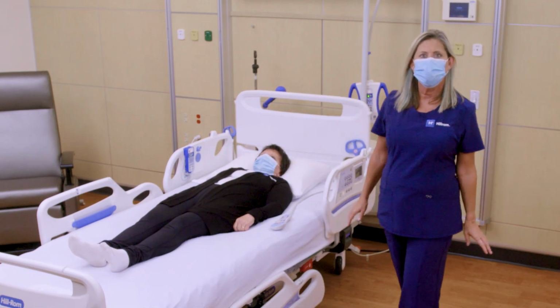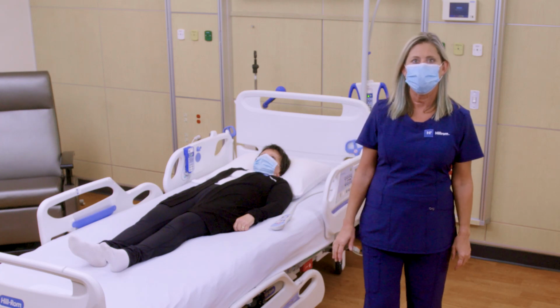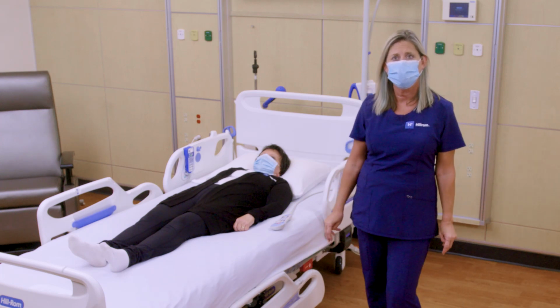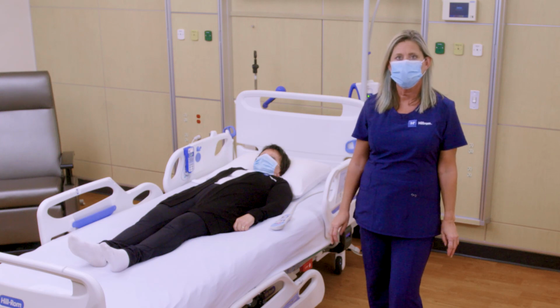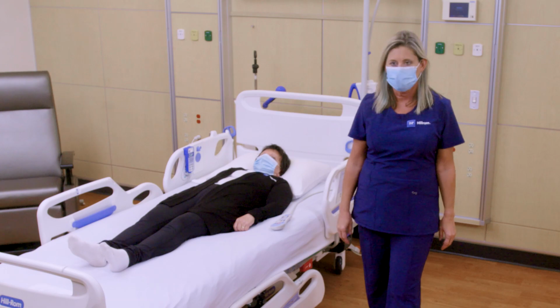I will provide you a high-level overview of Navicare Patient Safety. This platform will allow you to maximize the use of your care communication tools into a single, unified safety platform. It all starts with the patient assessment.